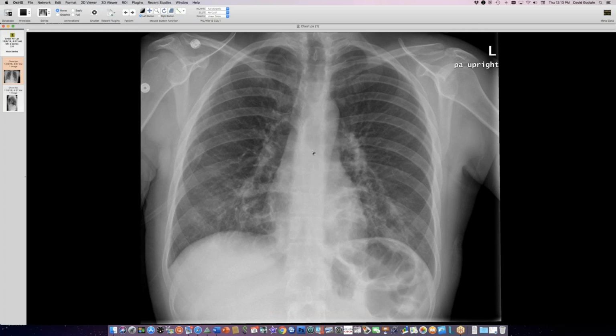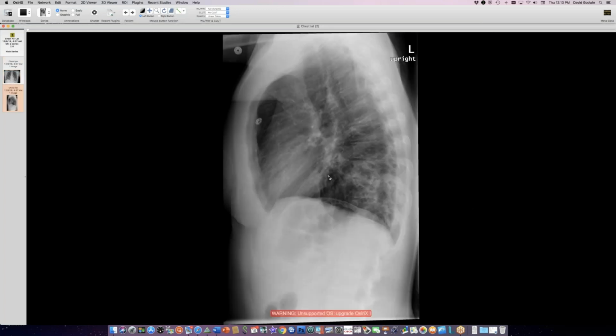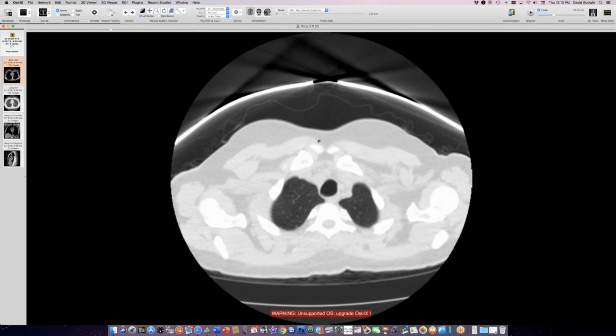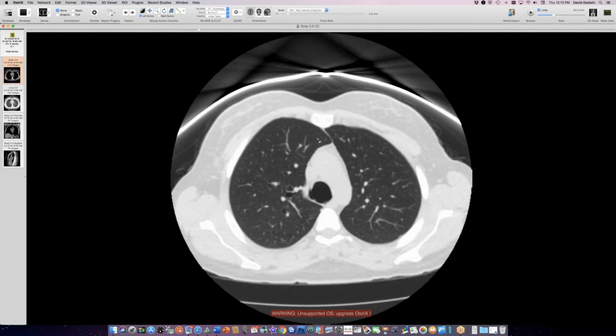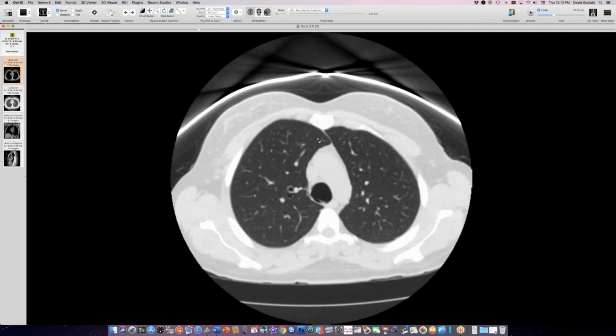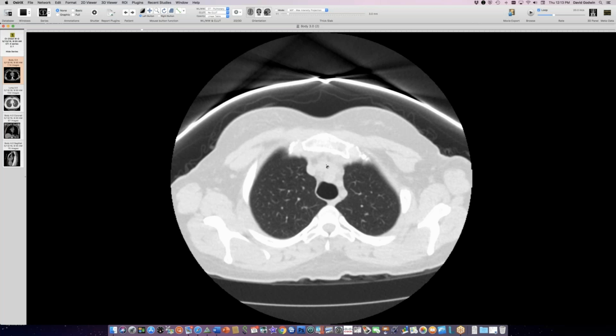So this bronchial caliber here, it doesn't leap out at you, but this bronchus is dilated. It's about the size of a normal trachea, and the right bronchus is similarly dilated. And there's a bunch of stuff in the bases here. And this is a case that we're calling Mounier-Kuhn syndrome, dilated trachea and bronchi. So tracheobronchomegaly, very nice irregularity here.